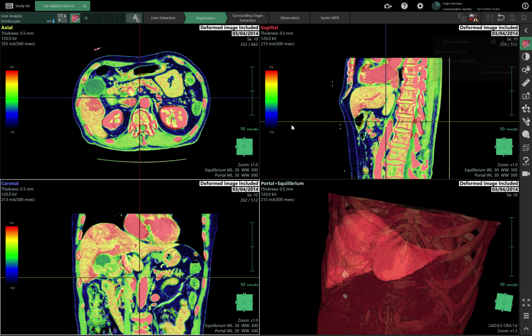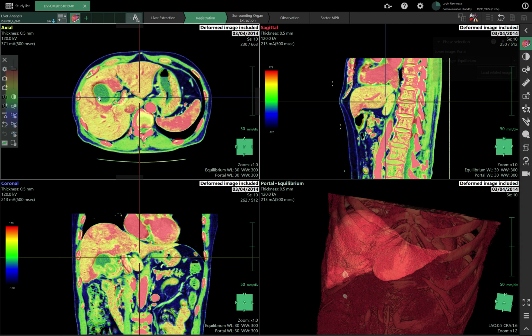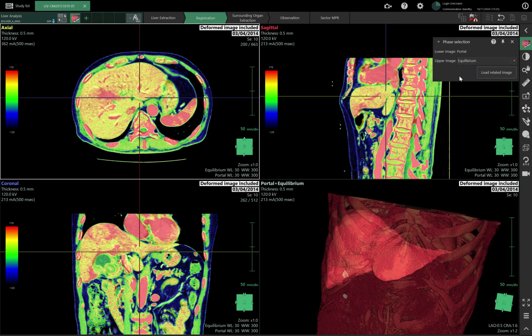So in the case of the cholangiopancreatography, you will only get that part of the abdomen, maybe lacking the front part of the abdomen or the back part of the abdomen. You will have only the part where the bile duct and everything else is. Okay, so in these cases, for MRIs, you cannot use the non-rigid registration, because it will distort the images too much and will not fit the shape of the liver correctly.